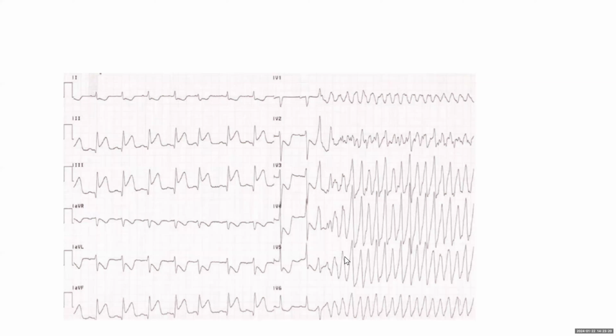Okay, good. So you said sinus rhythm, VT. Some of you wrote polymorphic VT, which is absolutely correct, but it's not in the code. So just get used to reviewing the coding sheet. So VT, and we said when you have VT, you have AV dissociation, and then inferior MI, recent. Posterior is also correct, probably. I think it's a fair one to write. And then you can write ST-T changes due to ischemia.